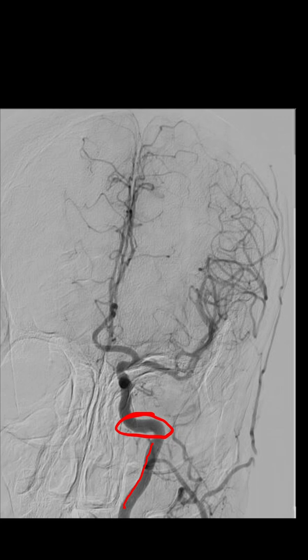What is this dense area? This is the ophthalmic curve or the cavernous curve where the ophthalmic artery arises. Because it's a curve, this is an end-on view that produces this dark image, and this is the distal end of the internal carotid artery dividing into the middle cerebral artery, which divides into upper division, lower division, and all the branches. Here is the A1, which is a very large A1. Why is it a very large A1? Here it is supplying both sides.